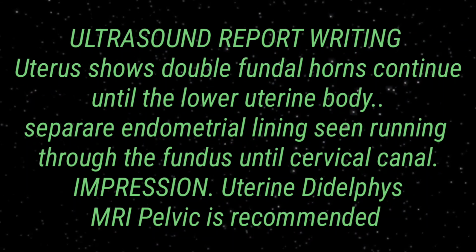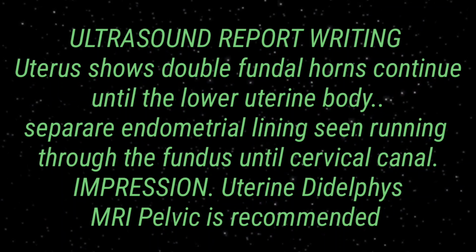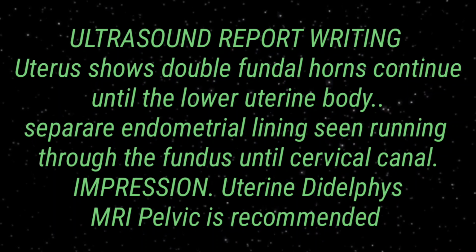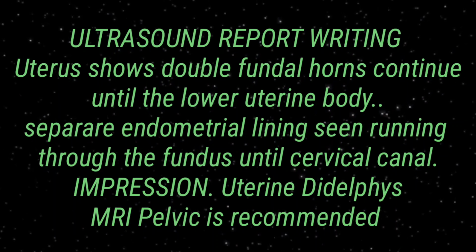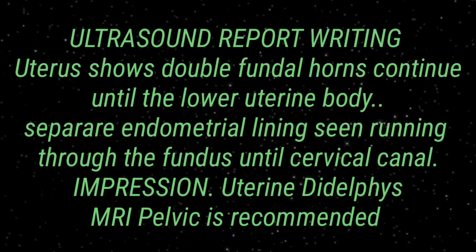And besides this you have to mention the separate endometrial lining all the way down from the endometrial canal until the cervical canal, so that it makes clear sense that you are depicting the uterine didelphys.